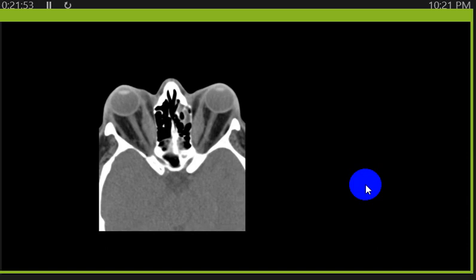What we see here. Bilateral enlargement of the muscle belly of the medial rectus. Bilateral enlargement of the belly of the medial rectus muscle. Okay, this is with what? Thyroid ophthalmopathy, consistent. Sparing the tendon. She said belly of the muscle, sparing the tendon. It is okay. Is there anything else with it?